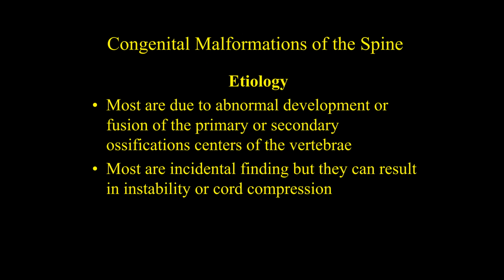Okay, congenital abnormalities of the spine. Let's talk about some abnormalities of the vertebral bodies and the dorsal articular facets and the end plate that can happen. And some of these may or may not be clinically significant, but you will see them pretty commonly as you go forward.